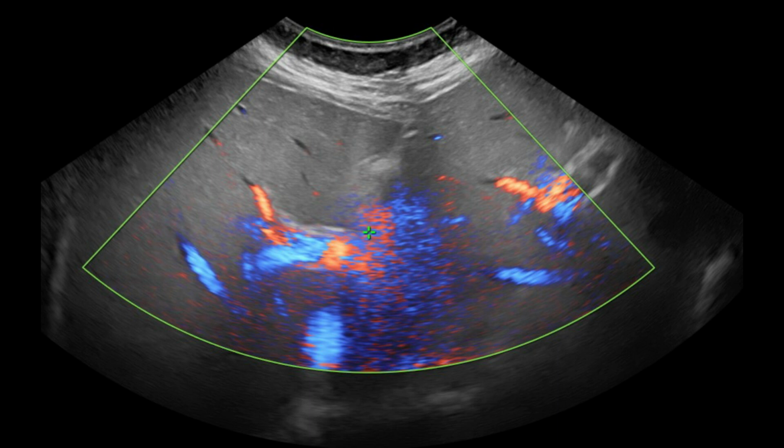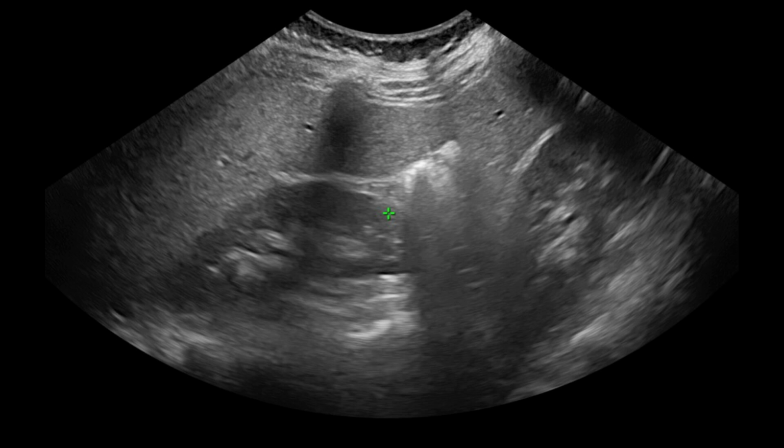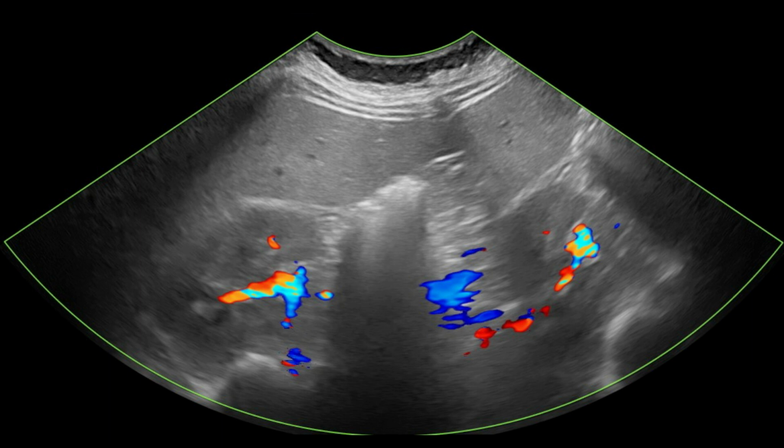Please go through all the images, think about the findings and tell me what this is, why, and what to do in such a situation. If you want more time, please pause the video and reassess. Now we can go for the discussion. Are you ready? Let's go.